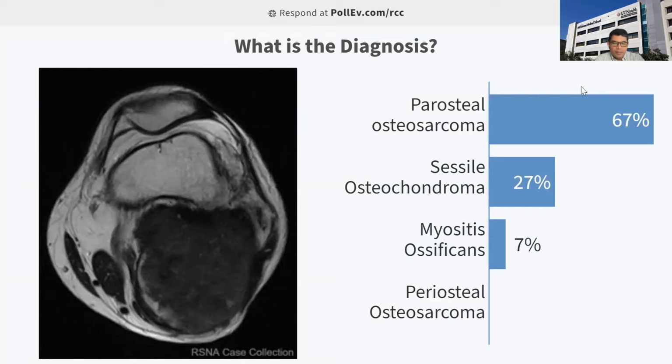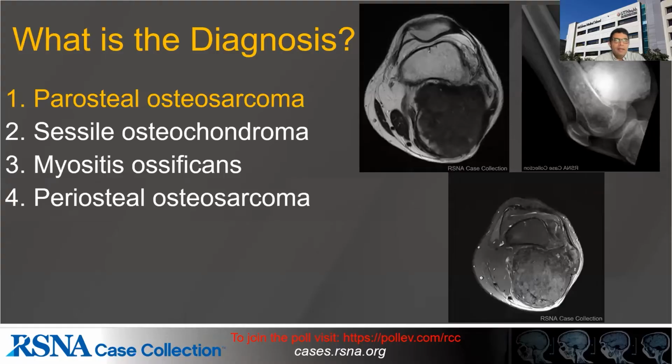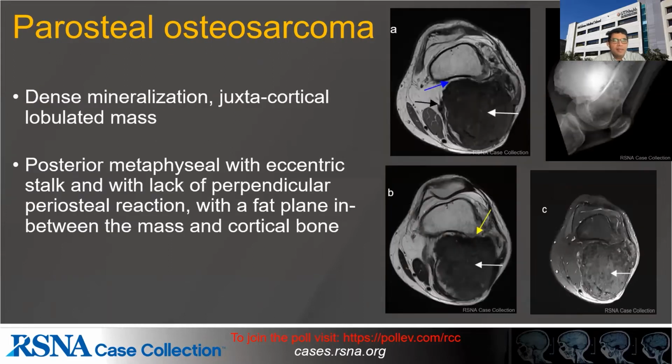All right, so if we go to the next slide, please. So the diagnosis is going to be parosteal osteosarcoma. We can see these images again. If we go to the next slide, please, again.